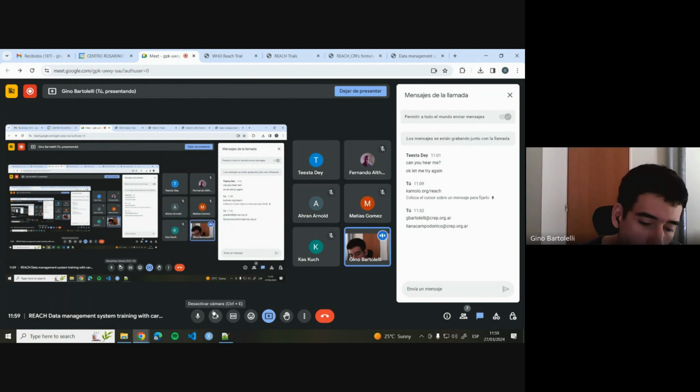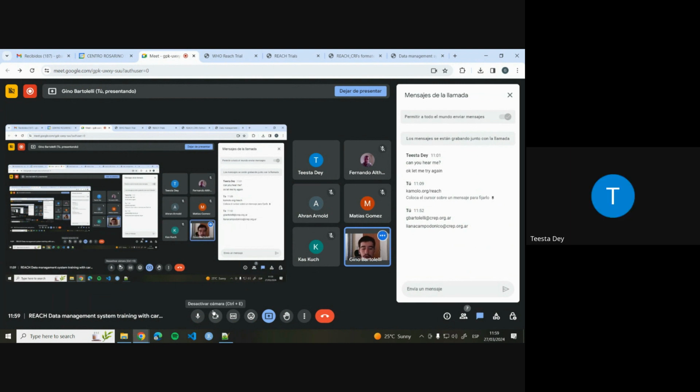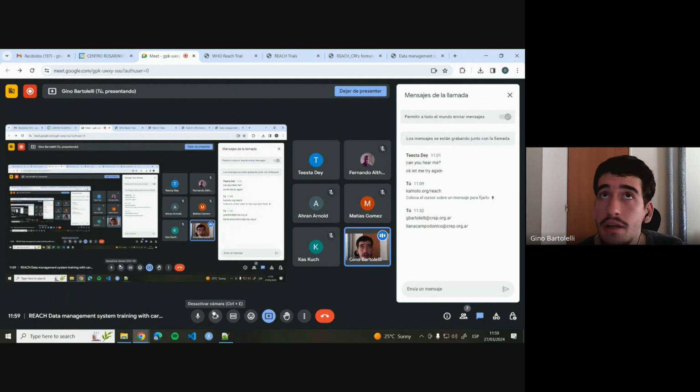Yes, we provide a double entry comparison because we think that it is something automatic and you don't have to think so much. But if you detect a discrepancy, you can simply access the form, manually perform the modification in the corresponding field, and make the correction. But that implies a lot of extra steps.